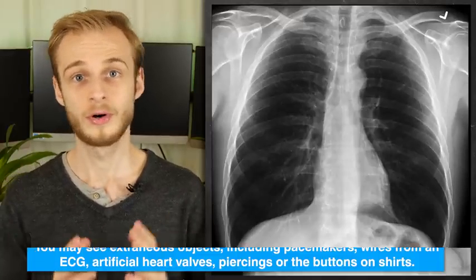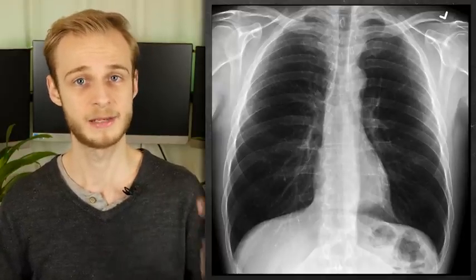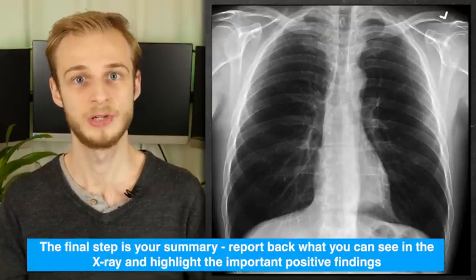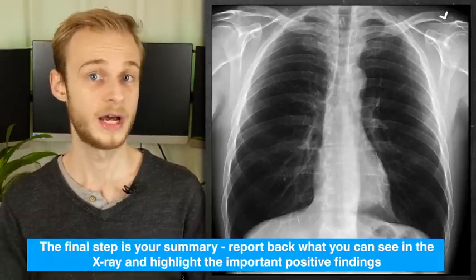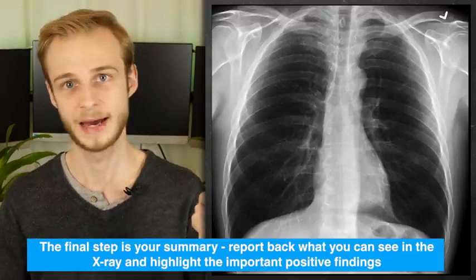And now we've got all our information, we've assessed the quality of the image, and we've clinically assessed the patient and interpreted the image. So at this point, it's time to summarize our findings and present them back to our supervising doctor. You should combine any information from the x-ray with other information you already have, or anything else you know about the patient that will help you come up with a diagnosis and a management plan.